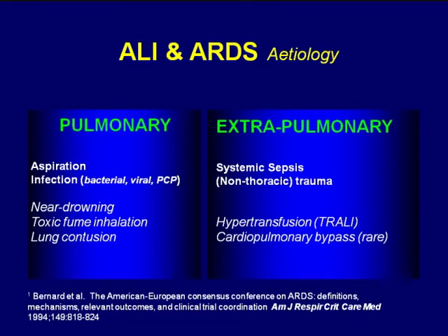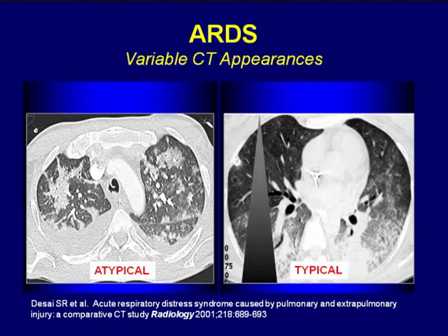Now, this is quite useful when we come to consider the CT changes, because shown here on your left and on your right are the two caricatures of ARDS that we've come to recognize.